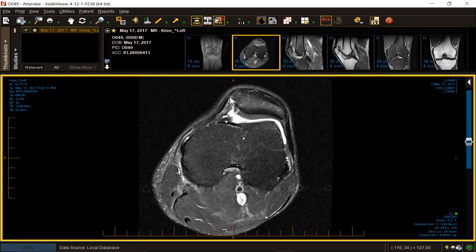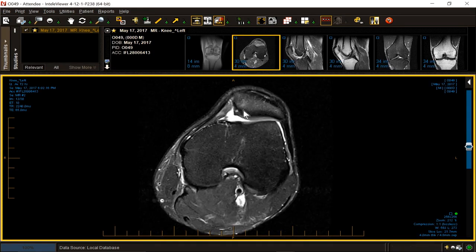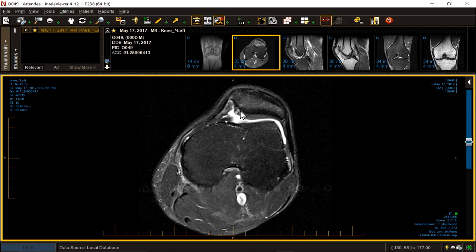He does have a slightly short medial facet and a longer lateral facet, so mild dysplasia anteriorly. He does have anterior patellofemoral chondromalacia, but so do all athletes. And that doesn't fit at all with his history, which is posterior and medial.